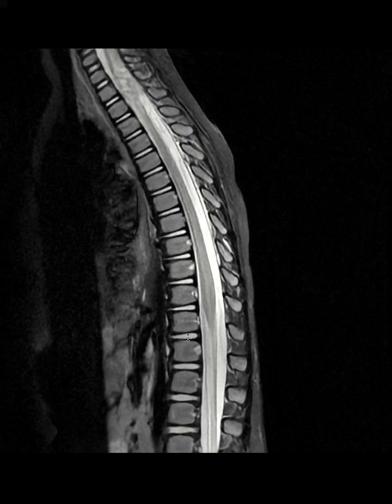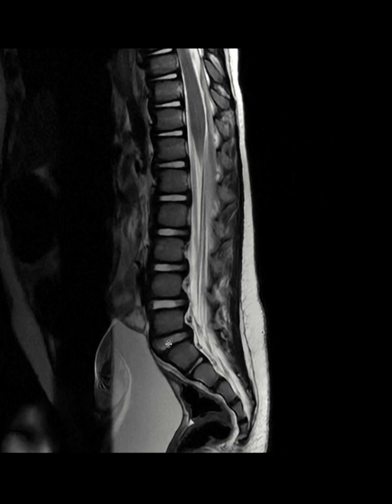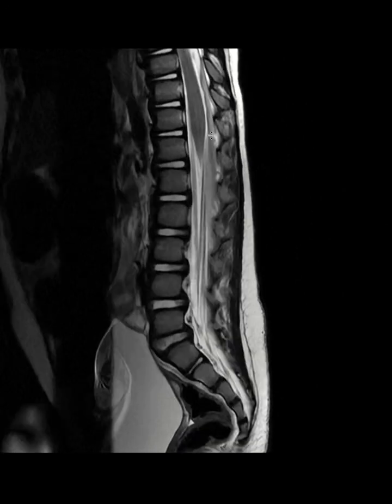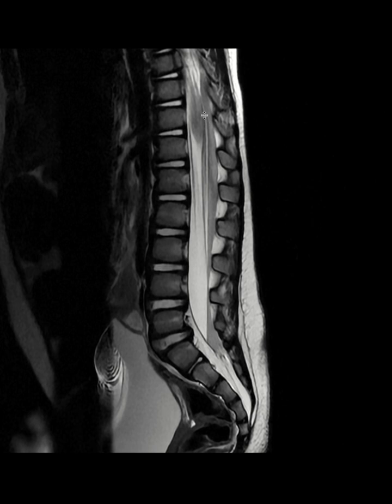It's going to be a little bit difficult to see on that, but if you look at the T2 sequence or the T1 sequence, you're going to see that this fluid is on top of the dura. So this is the dorsal aspect of the thecal sac, and the fluid is compressing on it. So this is the epidural collection in the dorsal aspect, and then this layering fluid down there is going to be subarachnoid hemorrhage.